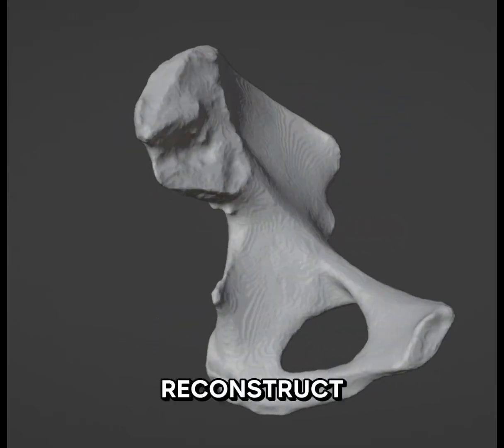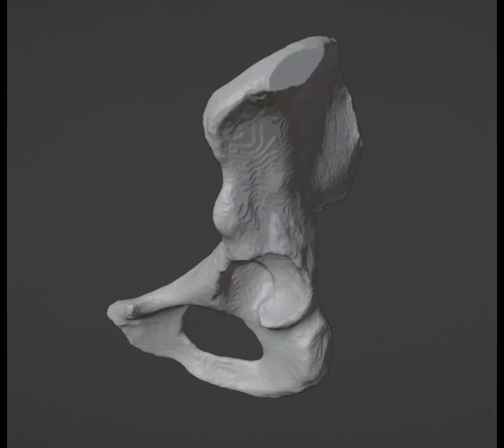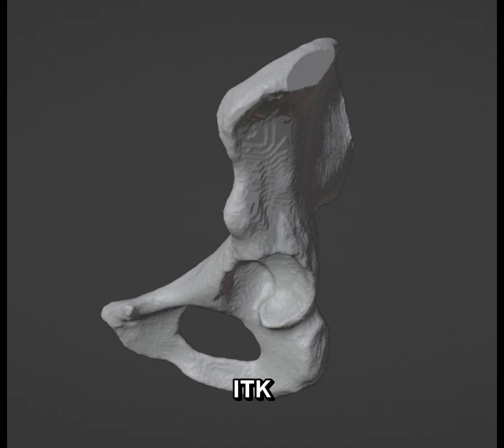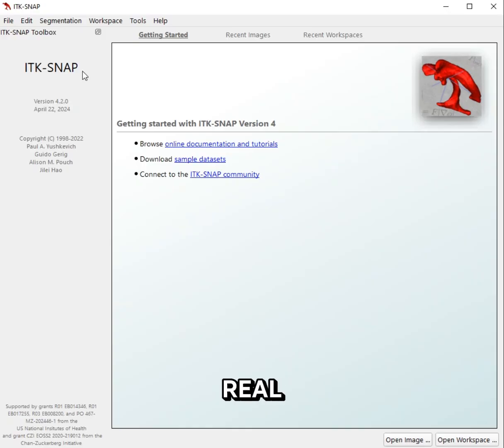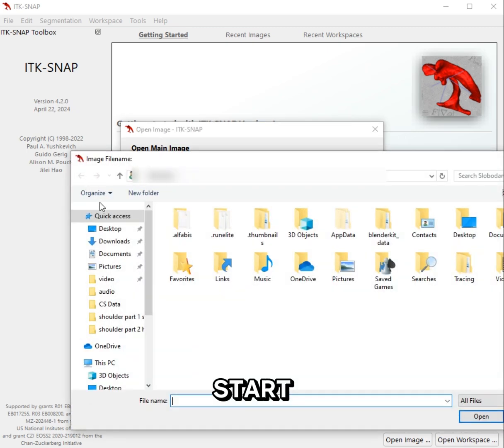Today I am going to reconstruct a hip case that was requested for research purposes. This time around I had to use ITK-Snap. This software was a real pain in the ass. But aside my personal feelings, we can start the reconstruction.